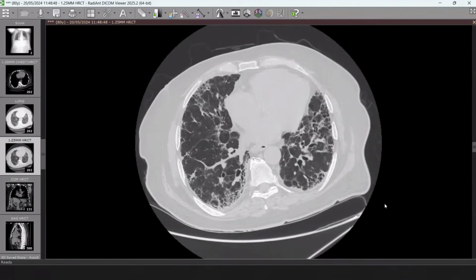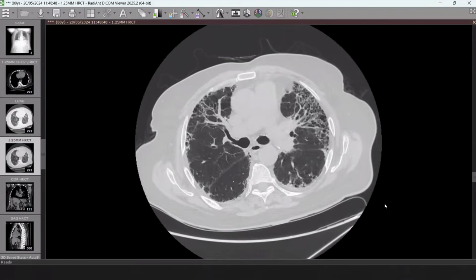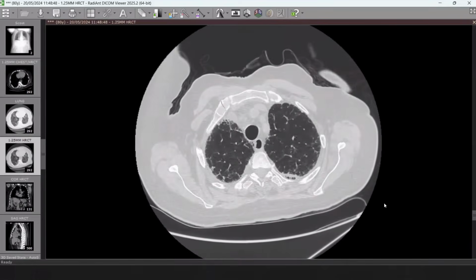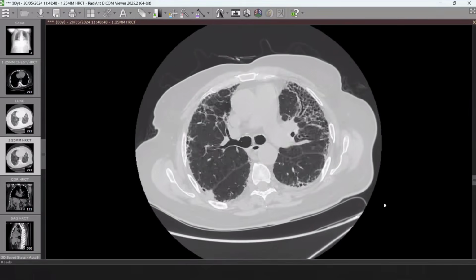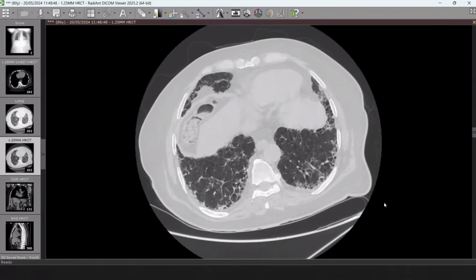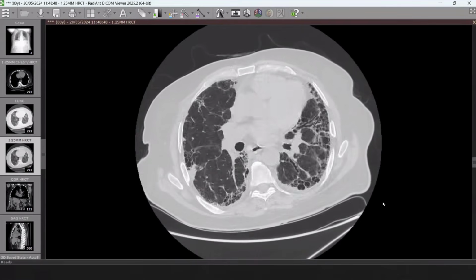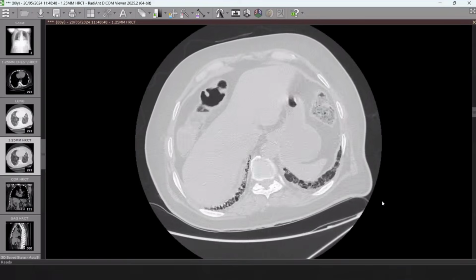Okay, I think there is a bilateral background of emphysematous lung changes. There is also mainly apicobasal interstitial fibrotic changes in the form of interstitial septal thickening and honeycombing and traction bronchiectasis, mainly in the subpleural regions and lung bases, filling the costophrenic recesses. So I am thinking maybe associated with collagen vascular disease.